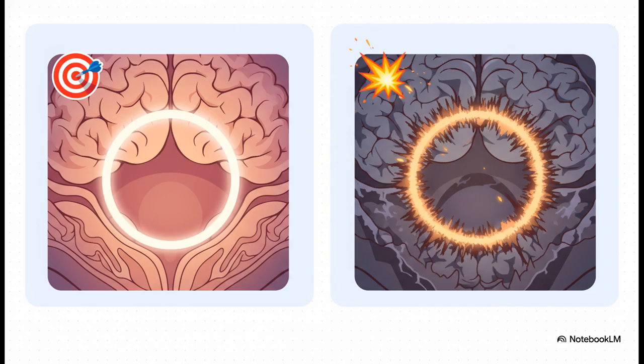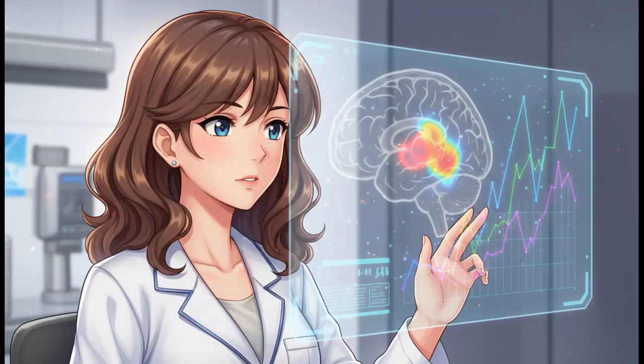That simple difference in the wall is huge. Smooth and thin should make you think infection. Thick and irregular, you've got to be thinking malignancy. Okay, but what if it's not so clean? What if the ring is kind of in between, ambiguous? The morphology just isn't classic.